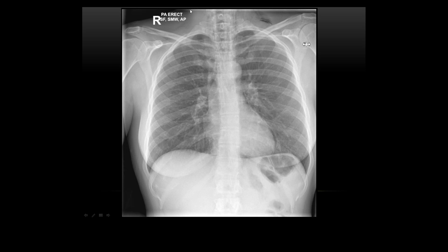Of course. So you see this here. This is all subcutaneous. Compared to this side, there's nothing here at all. But then you've got this area underneath the soft tissues there. So subcutaneous emphysema could be coming from a pneumothorax, and we've got a penetrating wound. It could be coming from a pneumomediastinum, or it could also be coming from pneumoperitoneum, so it can travel straight from the mediastinum and go into the neck. So we know there's three things we're going to be looking for closely.